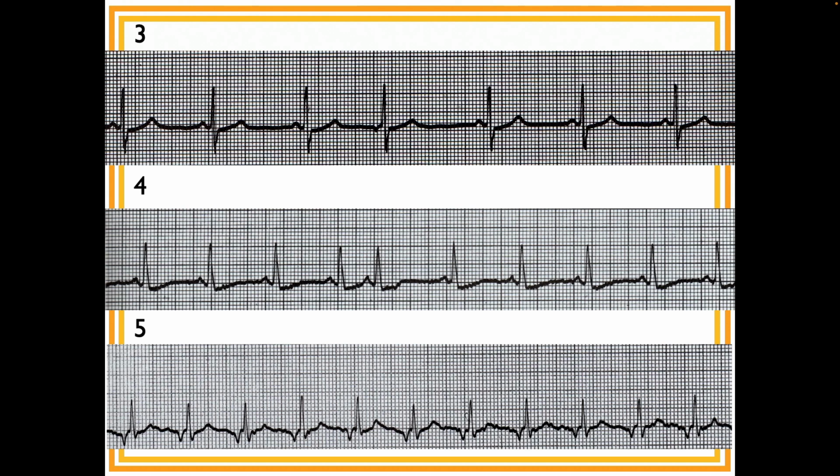Oh, right. PAC. Oh, no, wait. PJC because it's inverted. Perfect, there you go. So it's a borderline sinus Brady or normal sinus rhythm with one PJC. Good job. PJC, because the P wave is inverted, that means it's junctional. If it was a PAC, the P wave would be upright. Correct.